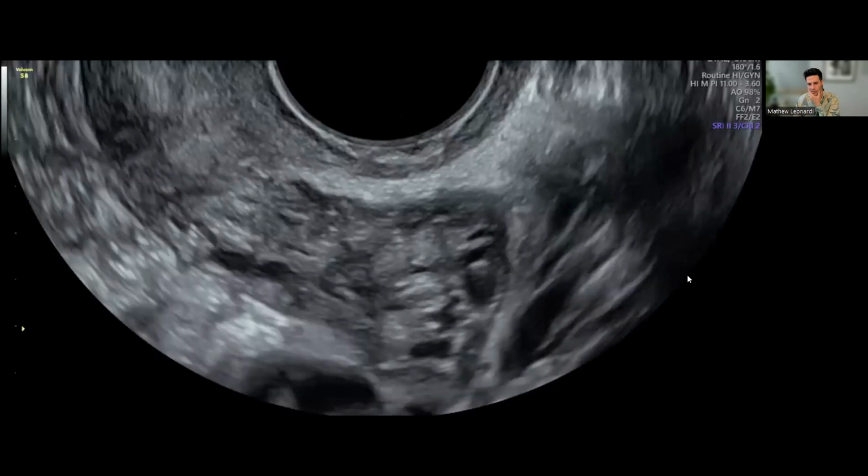And so here we have a nice depiction of a normal uterosacral ligament. In this case, this is going to be our right side because we already know where our abnormal side is. And you see the nice white band. We see that it fans out as it reaches the sacral aspect. In retroverted uteruses, uterosacral ligaments can sometimes be a little harder to appreciate. They can be much longer and stretched along that posterior vagina, as the posterior vaginal fornix is larger in a retroverted uterus. But this is a really nice classic depiction of that.